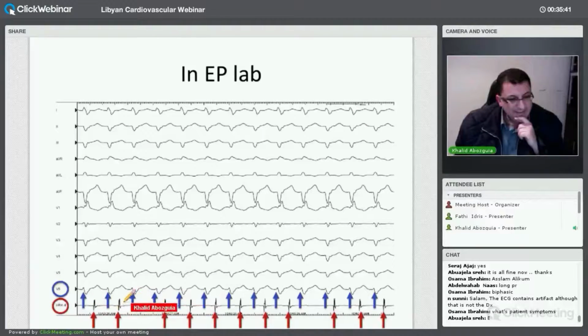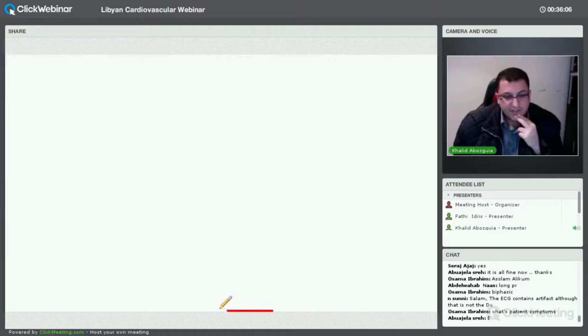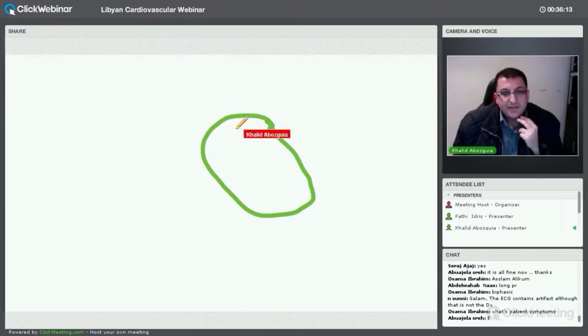And also, it doesn't look like there is a constant relationship, maybe, but definitely this V here does not have an A, and this V does not have an A. So there is more V than A. So I'm just going to, hopefully my last illustration, go back to this one. So this is the heart, given my bearing.